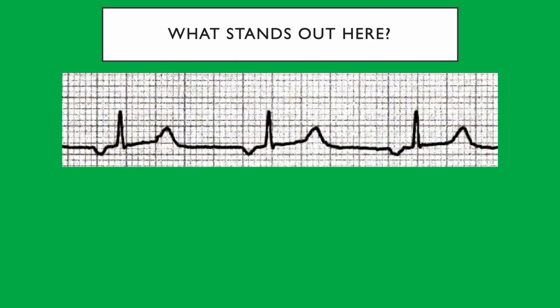What about this one? What's the problem here? Can you see? Can you come closer? What year are you in? Second year. Okay, I hope you understand. So what is the problem here? What is the next step I have to do now? I found an inverted P wave. What am I looking for? I have to check if the leads are put correctly. But the QRS and the T are normal, otherwise everything would be inverted, right? So the next step is the PR interval. What does PR interval represent? Atrial.